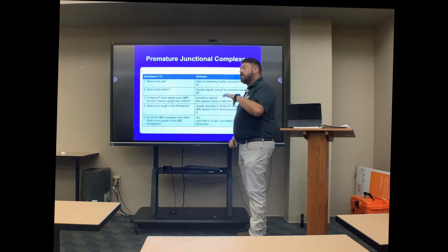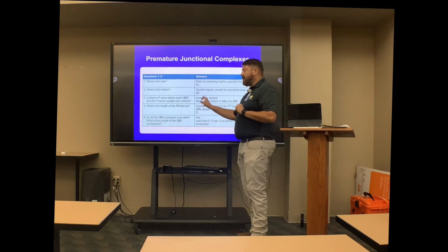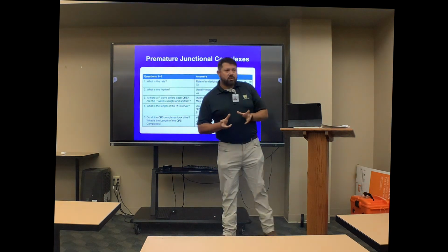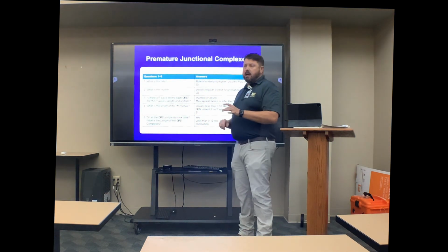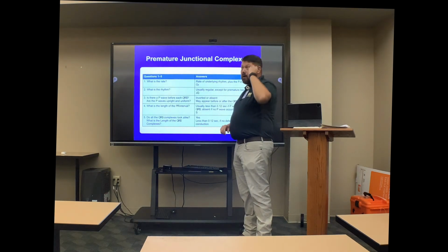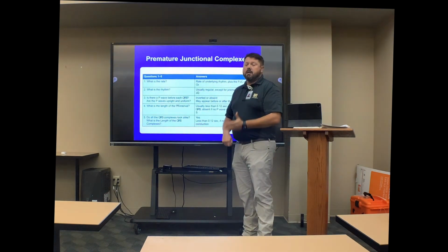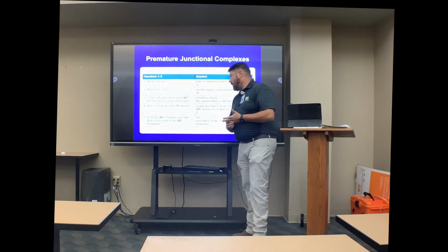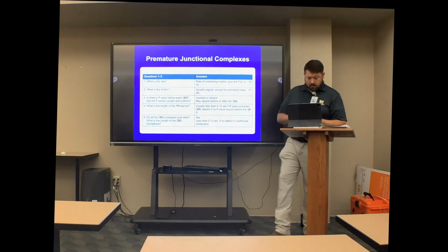For the PJC itself, though, it's either going to be inverted or absent, and sometimes it may be inverted and post-QRS. The PR intervals should be within normal limits for your underlying rhythm. If you have a retrograde P wave pre-QRS, you would just measure the PRI the same way, okay? And then your QRS complexes should all look alike across the board, all right?